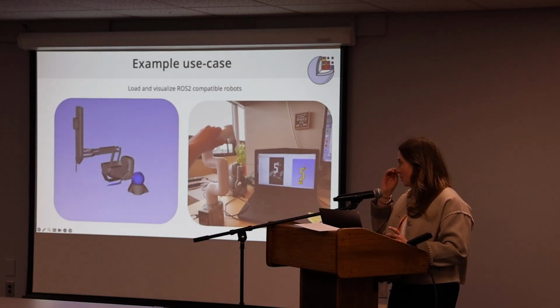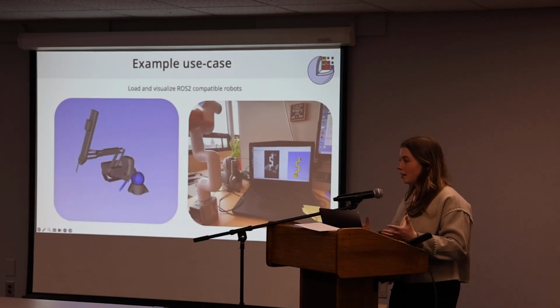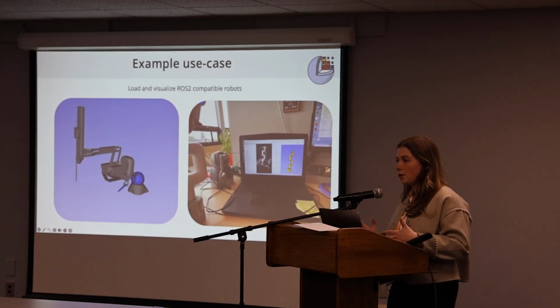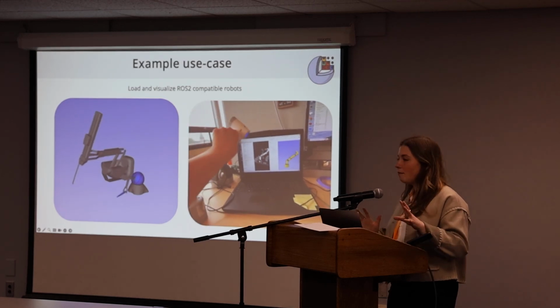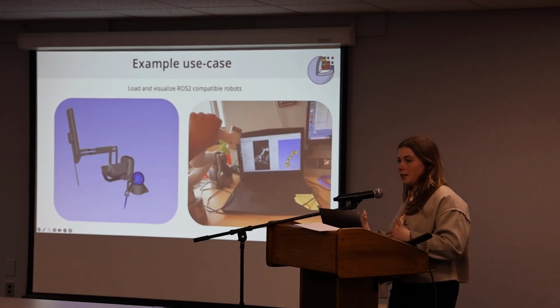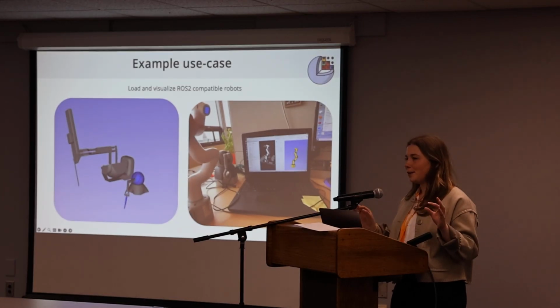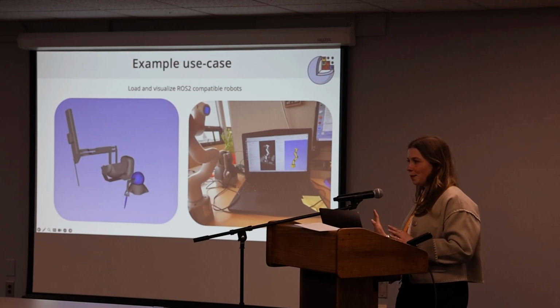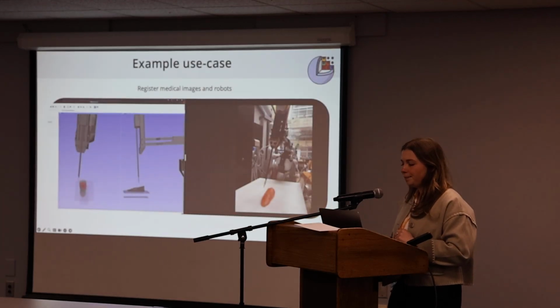And for those of you who just joined, we saw a lot of this this morning, but the primary application is that you can load and visualize any ROS-supported robot. So you're seeing the catheter today. I'll show you a UR later. But if you have a robot state publisher for your robot, you can use the module. Previously, we only supported STL files, so you had to do an annoying conversion. But now we support DAE, so you should be able to just load your robot in no problem.